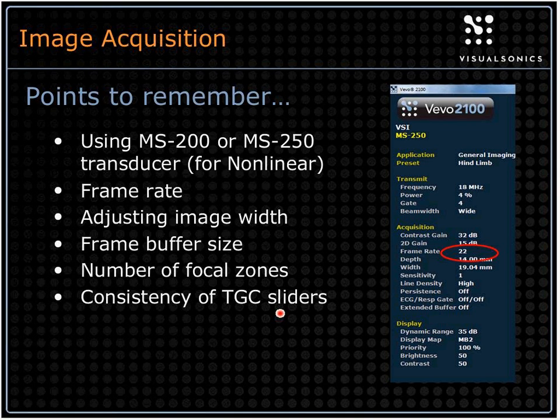So there's a couple different ways of doing that. One is to just set the sliders to the little catch in the middle. If you slide those sliders back and forth in their grooves, there's a little catch in the middle where they'll sit. So if you set them all in the middle, that's a nice home position.